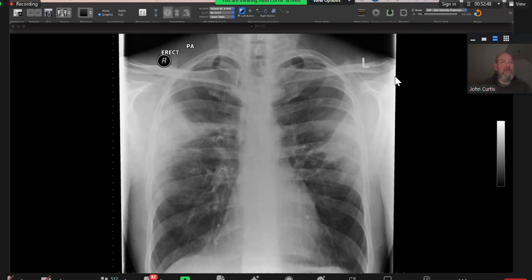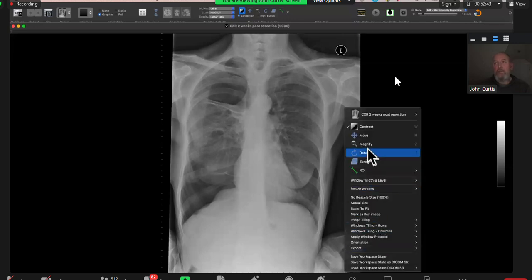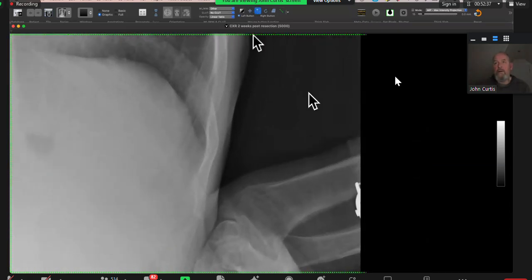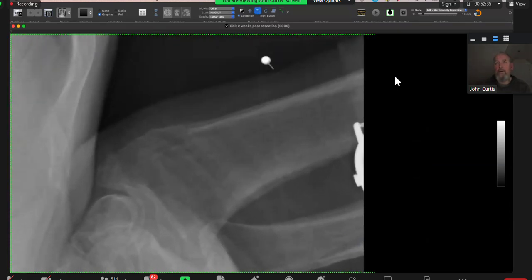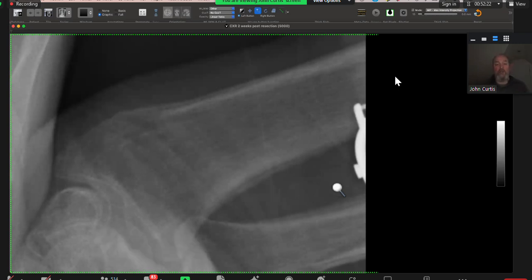This is one of my favorite films. That is HPOA or HOA. Why do we call it HOA and not HPOA? My understanding was if it's pulmonary related, then you call it HPOA. That's probably true. It's actually called HOA now because there are more causes than just pulmonary. Yeah, but that will give the patient clubbing.